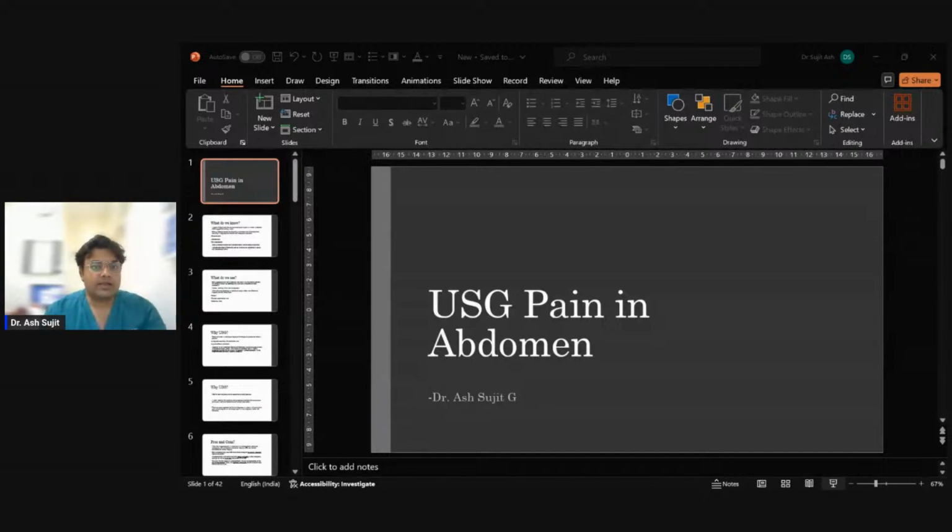Blood is echogenic at the time of early hemorrhage; the blood products will gradually evolve and become progressively more hypoechoic over time. The classic appearance whenever you think about a hemorrhagic cyst, which I'll show you in the next slide, is called a lace-like or spider web-like pattern. You see this pattern because of fine avascular septations, which are actually not true septations but represent fibrin strands formed because of clot hemolysis. This is what the pattern will look like. I'll quickly show you and then come back to this again. In the first picture, you'll see the trabeculations or septations. That is what I mean by a lace-like or spider web-like pattern.